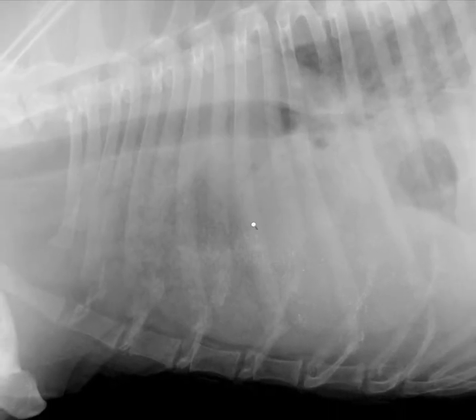The literature on lung lobe torsion would reflect that these dogs often have a lobar sort of sign where there's one lung lobe that's especially more abnormal. They virtually always have pleural fluid, and this vesicular pattern has been linked to vesicular emphysema present in the lung histologically. This is the equivalent of some sort of enlargement of the air spaces within the lung, but in a manner that's disorganized because of lung necrosis.